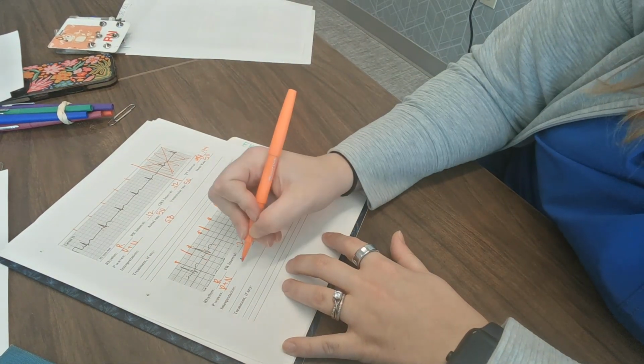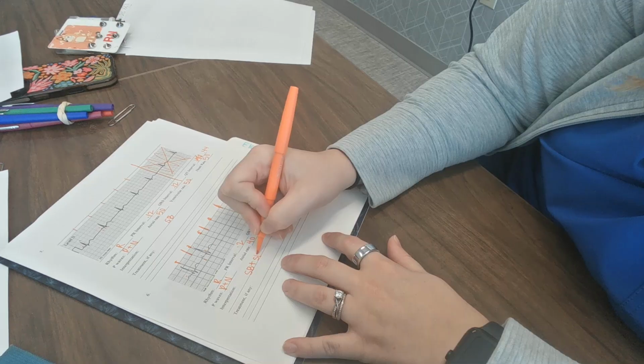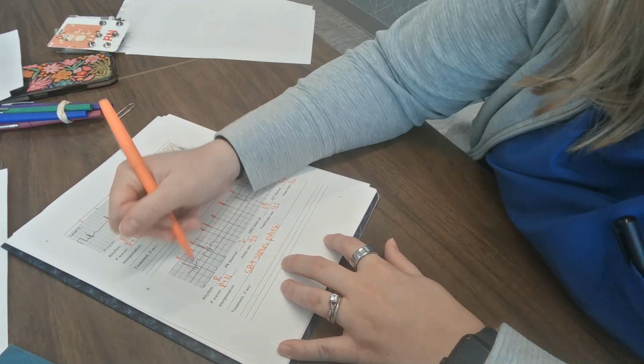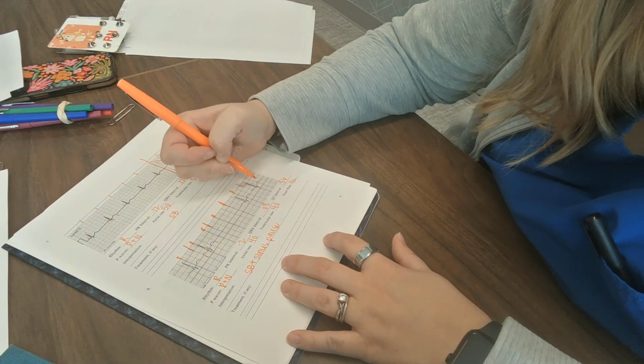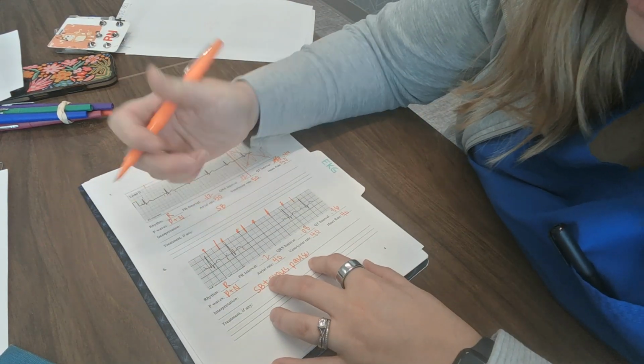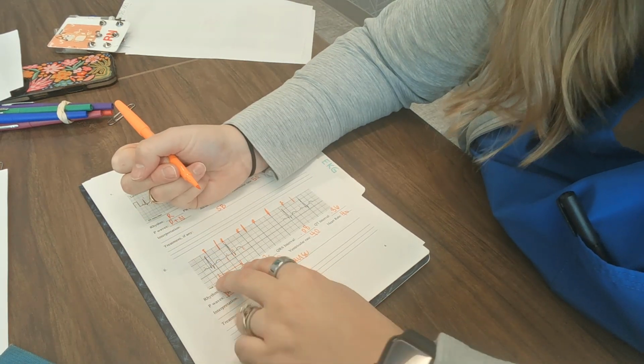So this is just a sinus Brady plus a sinus pause. Okay, so you always have to diagnose the underlying rhythm here, which is sinus bradycardia, but then you have the pause right here. And again, that's just because when you're looking, here's my R to R, right down here.